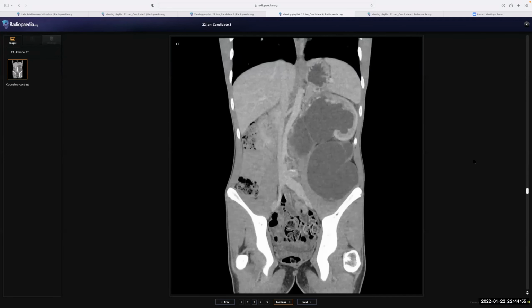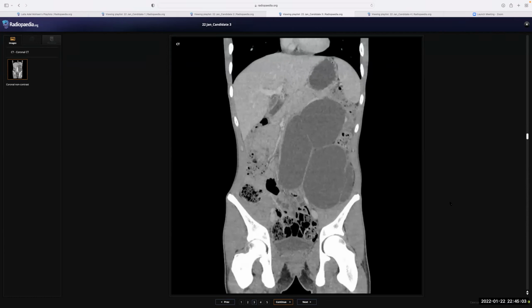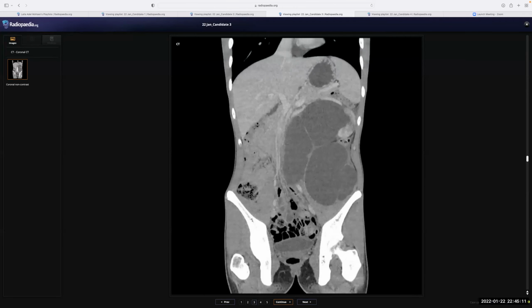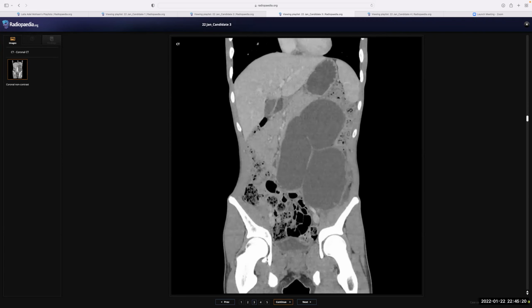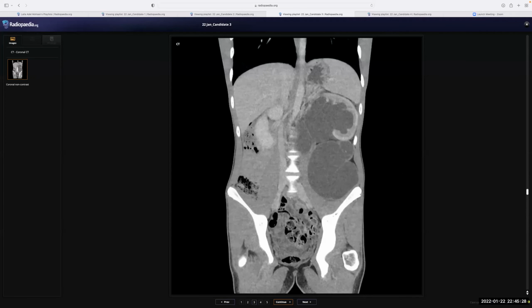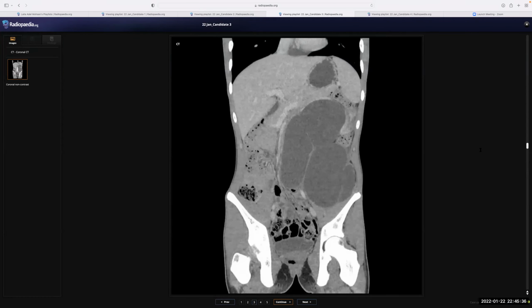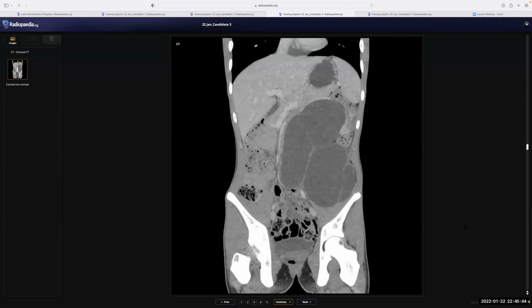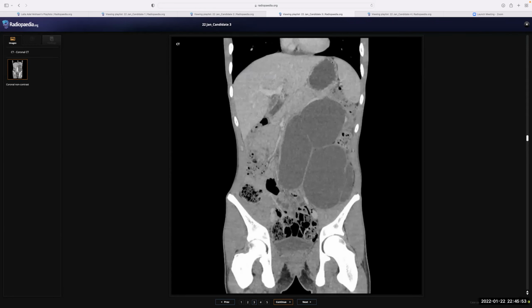I want to see the end of the ureter. I wonder if these are all due to the ureter or it is, I'm just trying to scroll it. I think I'm looking whether it is a duplex system or, well, I can't decide because there is a huge dilatation of the pelvic calyceal system, and there is another tortuous round structure in the left lower quadrant. Well, with that I can't trace it downward to the bladder. However, there is a linear, I think this is a vessel.